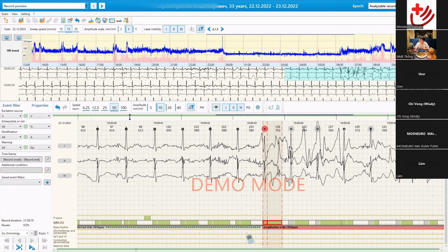And one important thing when you perform such editing of the record: sometimes you need such editing manually, sometimes you do not. It depends on the record, your purpose, the quality, and many factors. But anyway, you need to understand one thing, that you should not delete a QRS complex completely if it's just noisy. Some people make this mistake. That's why I'm focusing on this point.